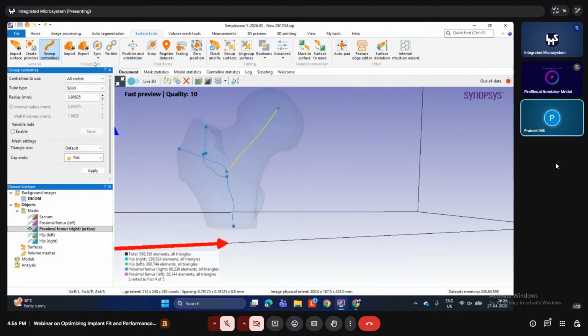Moving forward to the design link. So what is design link? When we are working on any CAD, as we have opened the surface tools, .stl, or any surface structure, we can directly import and export it into SolidWorks. It has import and export capabilities directly linked with SolidWorks with the help of the design link. And here we have the sync, and here we have the relink option. So this can help us in integration with SolidWorks hassle free. And these tools I have used.